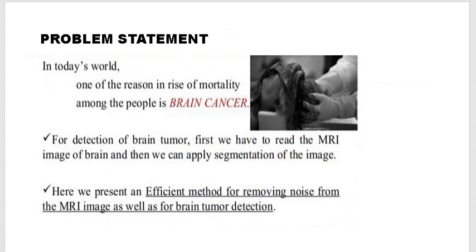When it comes to the problem statement, in today's world, one of the reasons for the rise of mortality among people is brain cancer. For detection of brain tumor, first we have to read the MRI image of the brain and then we apply the segmentation of the image.